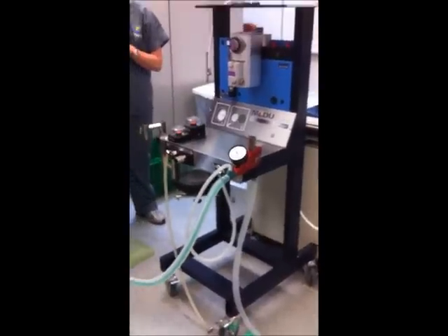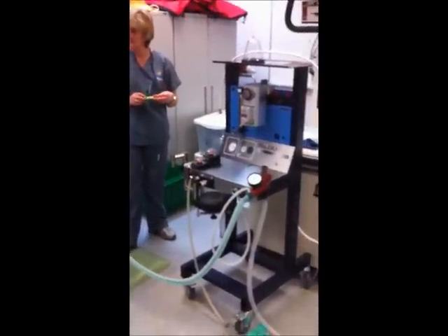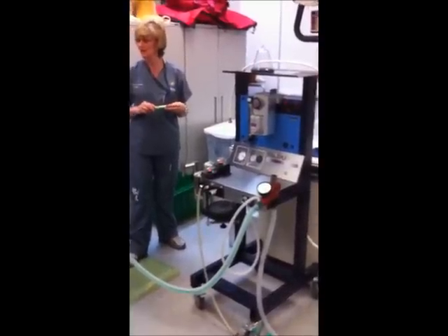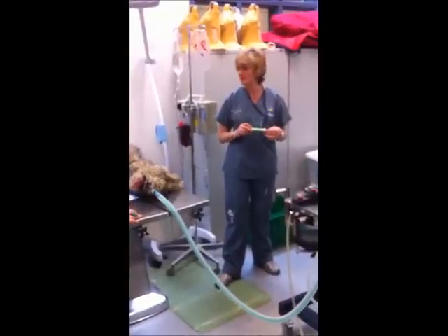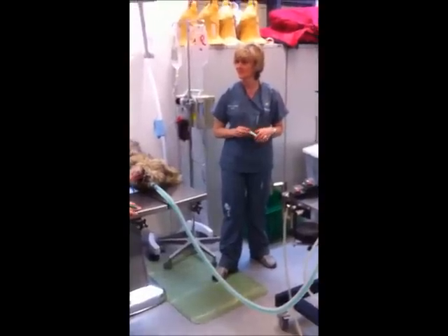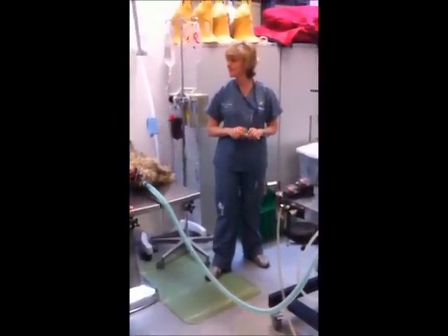And then what you would do is switch off the anesthetic. What do you do before that if you've got an emergency? What do you do before you turn off the anesthetic when you've got an emergency? Get help. Pretty much anything you do, we still get help, basically.